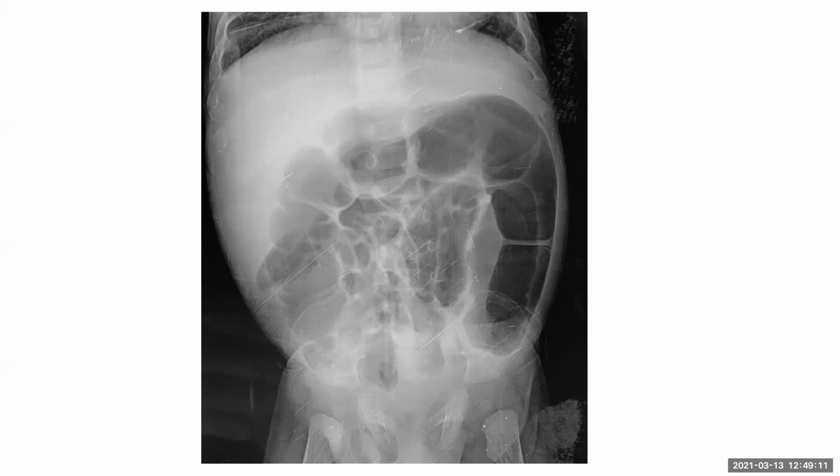I'm also looking for any other cause like anal atresia, but I cannot rule it out completely on this film. So again, I will urgently convey my findings, and as this is an emergency condition of bowel obstruction, the patient needs further imaging to rule out the cause, and an urgent pediatric surgery referral.